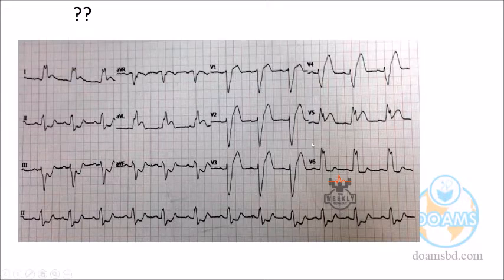Okay. So in a practical situation, if the patient has chest pain and the ECG shows left bundle branch block, it is said that this is MI until proved otherwise. It may be a clue also. Chest pain with LBBB, think that this is myocardial infarction. What does that mean? Refer the case to the CCU, cardiology. Remember. So this is the LBBB.